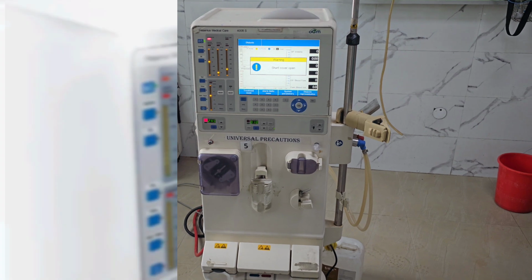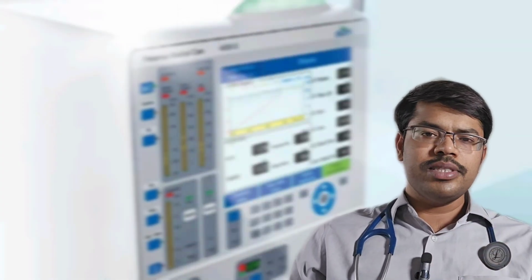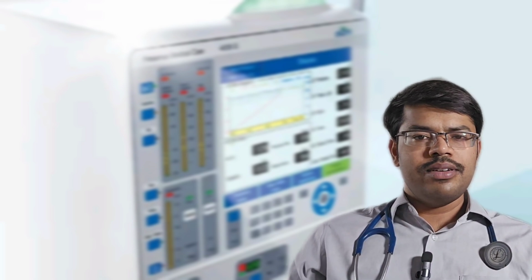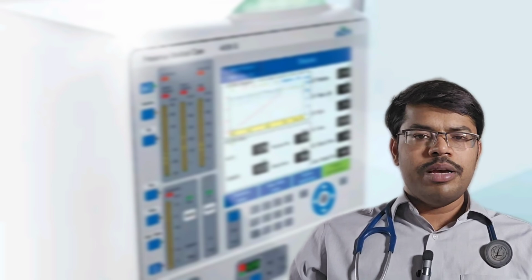So this completes today's video on the external anatomy of the hemodialysis machine. I hope you got some insight regarding this, and at least it should be helpful for the dialysis technologist.